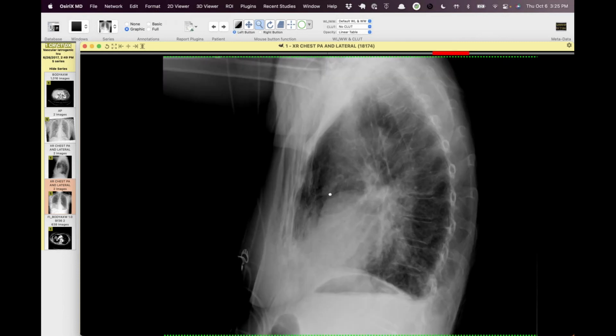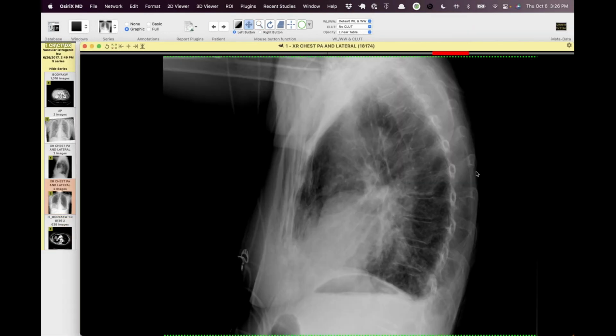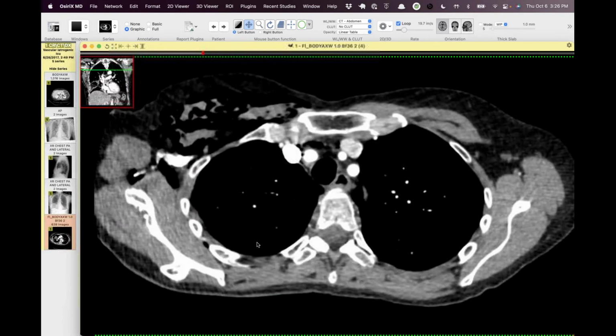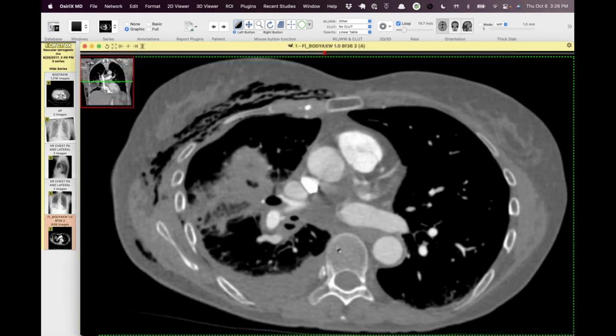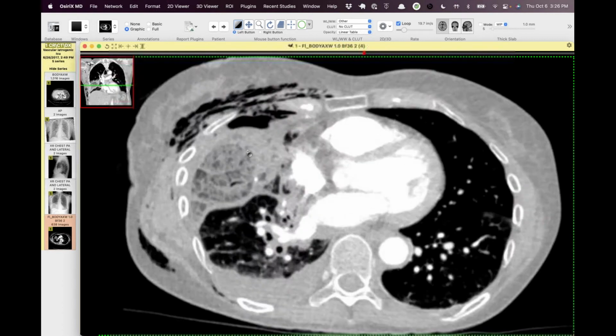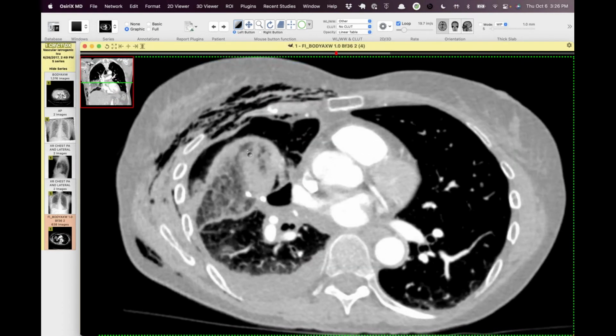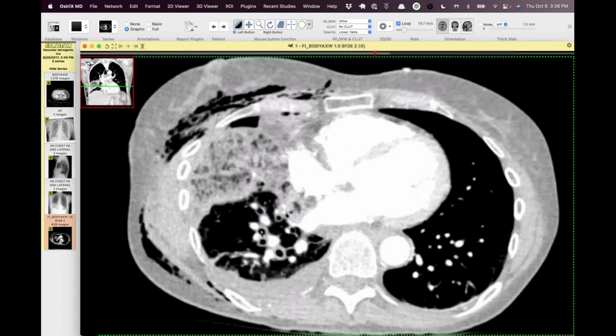Now you can see there's this opacity brewing in this area, and the patient's doing okay. On the lateral view, it corresponds anteriorly to where the right middle lobe was. Then they take out the chest tube, and that opacity is still there. It almost looks like an overdistended portion of lung here. It doesn't look like it's collapsed. So there was some concern of torsion, even though the right middle lobe still looks like where it is, and the right upper lobe is where it should be. Could it be something involving the segment, or was there just bleeding next to the lung?